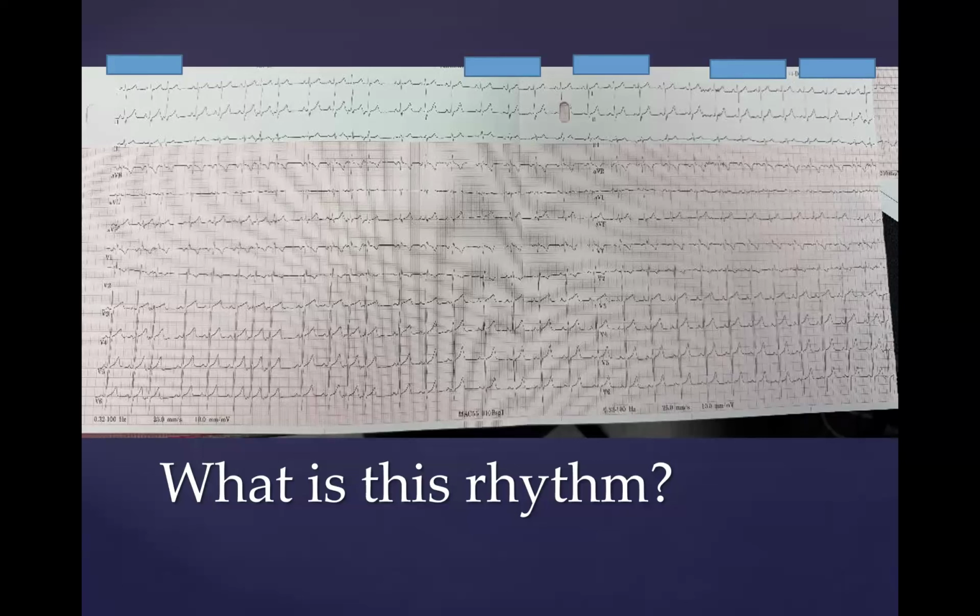Interestingly, if you look at the morphology of the P wave, you see that in the inferior leads it is negative, which suggests that it is actually posterior. So it could be a posterior focus, and so it could potentially be a little bit higher risk vis-a-vis injury to coronaries. But if it was in that area, one could also consider using cryo, although the cryo catheter is an 8 French catheter and is very, very stiff. Sometimes just manipulating that catheter in that area in a small heart can result in at least transient heart block. So that's one of the reasons why most of you have seen us use cryo very infrequently.